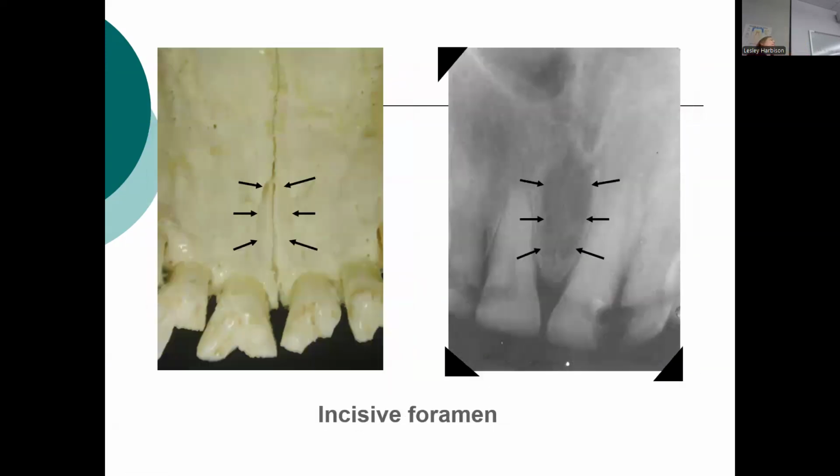Notice the arrows. This is what I was talking about. Notice how they are encapsulating it. You will see something very similar on the exam. So this is asking you about the incisive foramen. Yes, the suture runs through there, but this is pointing to the foramen.